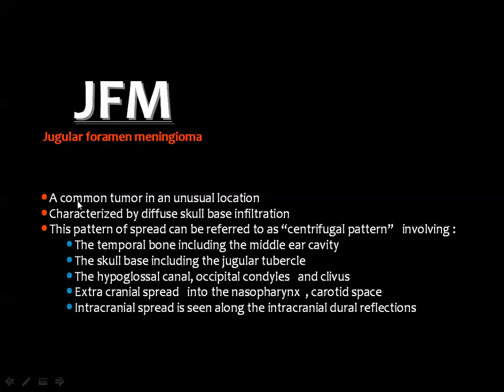As written here, it is a common tumor in an unusual location characterized by diffuse skull base infiltration. And this is known as a centrifugal pattern, which may extend to involve the petrous temporal bone, including the middle ear cavity, the skull base, including the jugular tubercle, the hypoglossal canal, occipital condyles, and the clivus, with extracranial spread into the nasopharynx and the carotid space, and the intracranial extent is seen along the intracranial dura.